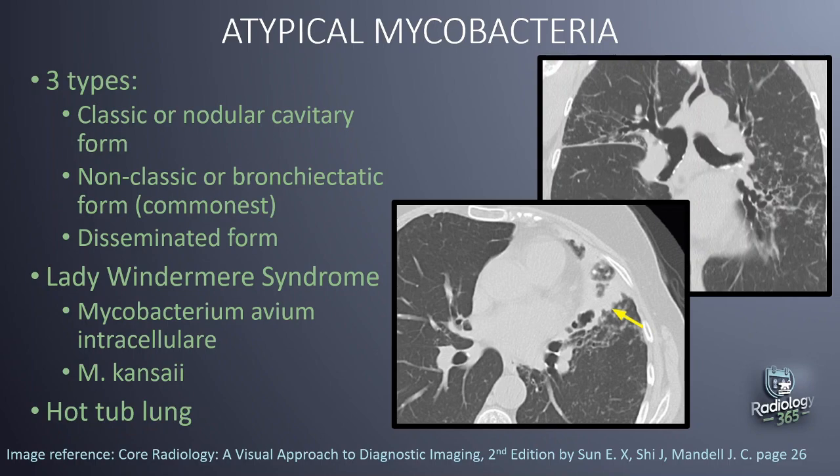So in these images, it's a case of Mycobacterium avium intracellulare infection, and in this coronal CT and axial CT, it shows right upper lobe and lingular tree in bud opacities here and bronchiectasis. You can see this varicoid kind of bronchiectasis, dilated bronchi here and here. And in the axial, we see this more focal consolidation here.